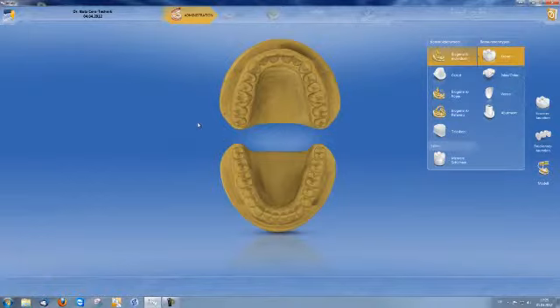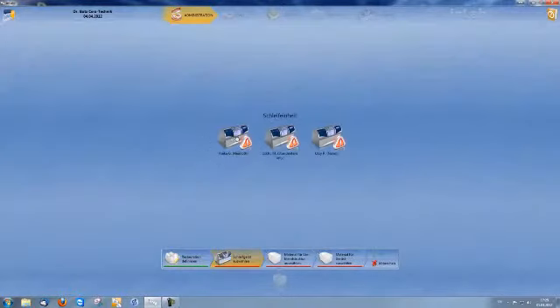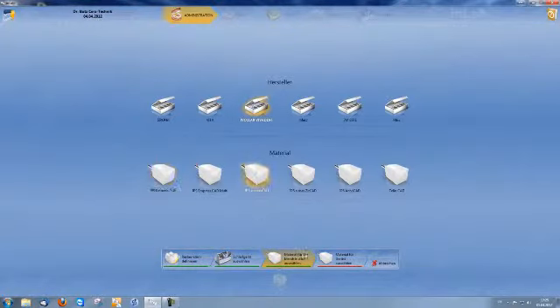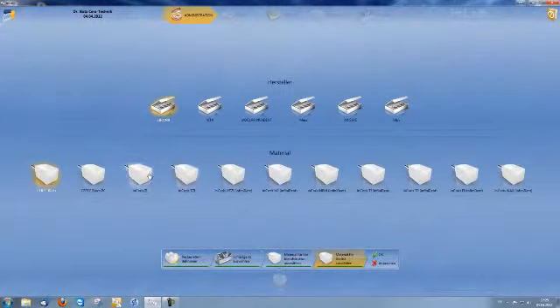We want to create a multi-layer crown. For this, I go to Individual Tooth Restoration, Crown, Biogeneric. That is the design mode, and several layers to work in the multi-layer mode. Click on Tooth 16. Select the milling unit. The veneering material, Emax CAD, and the framework material, and confirm with OK.